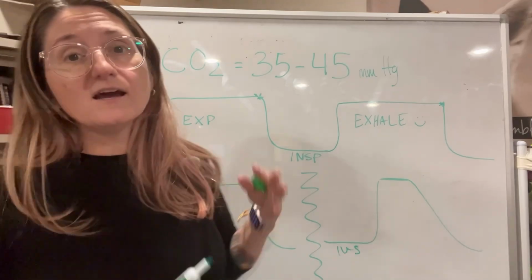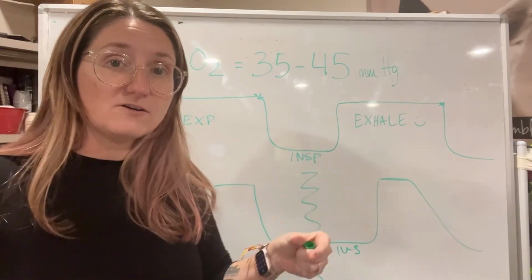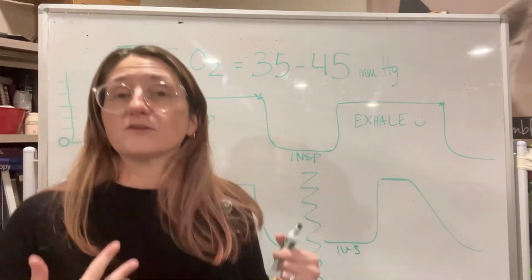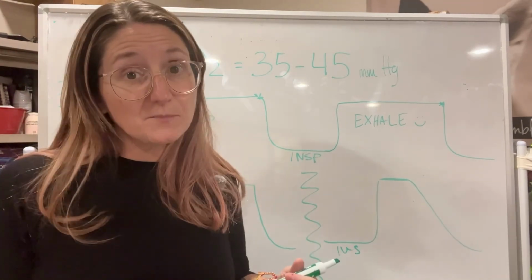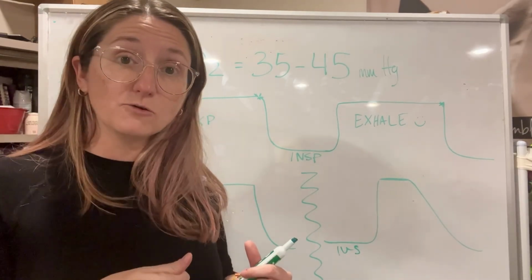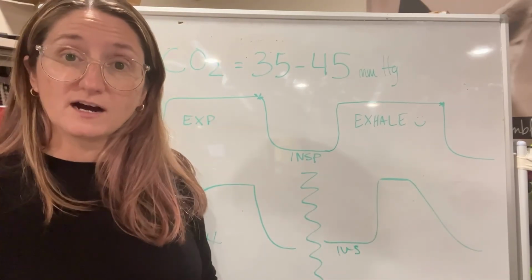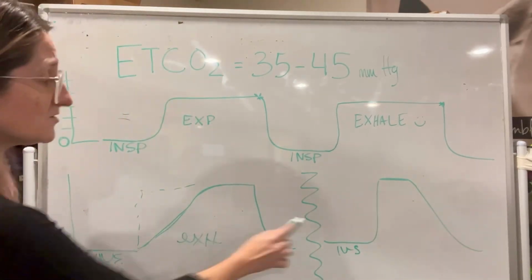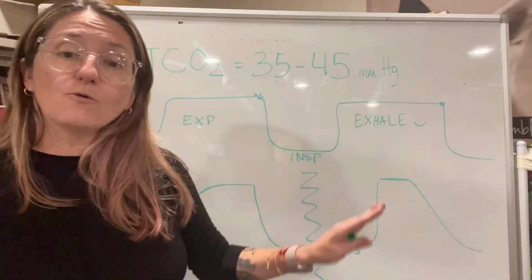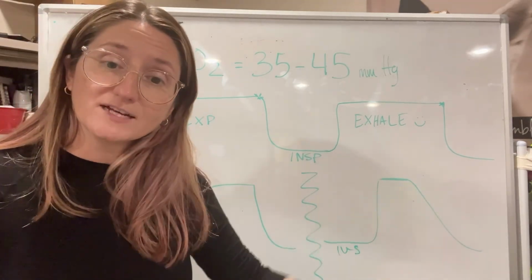Most commonly, our leak is right at the endotracheal tube or the cuff itself. So if you have a patient that has been under anesthesia for a long time, super relaxed or potentially even deep under anesthesia, check that cuff. Give a nice breath and make sure your cuff is still holding pressure, because if you can't hold, then sometimes you need to add a little bit to your cuff. Either one of these is going to tell you that there potentially is a problem with your patient or with your equipment. So if you're seeing either of these shark fins, you want to go investigate a little further.